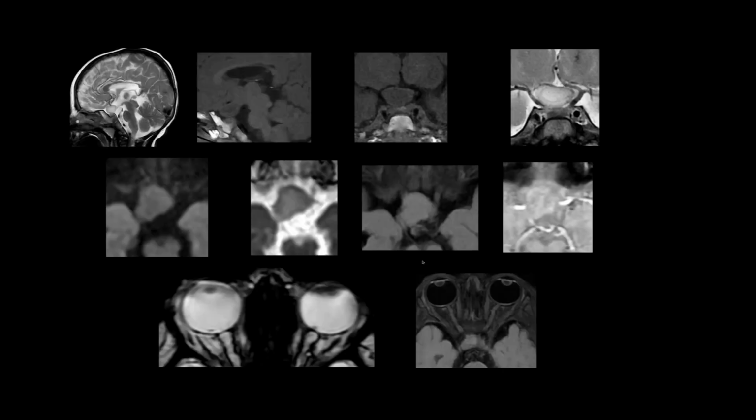The additional finding for this case was this suprasellar lesion, which had T2 mixed iso to hyperintensities with T1 iso to hyperintensity. It is fairly well circumscribed, no restricted diffusion, no abnormalities on the FLAIR or the SWI. The optic nerves, at least the distal segments, did not demonstrate any abnormality. There were areas of blooming on the SWI in the bilateral optic nerves, whether these are calcifications or not, probably CT would have been helpful.